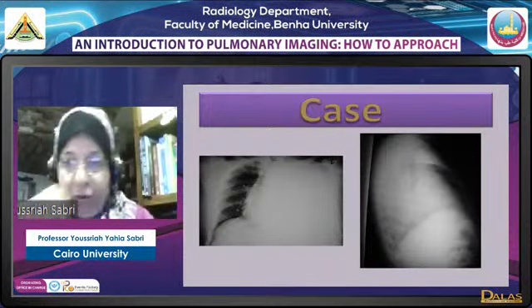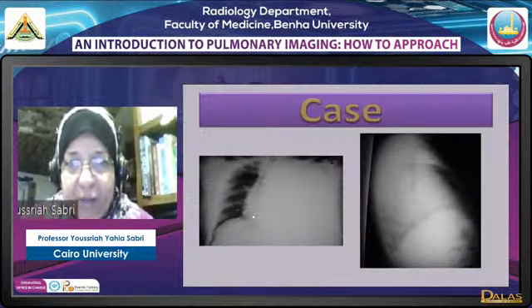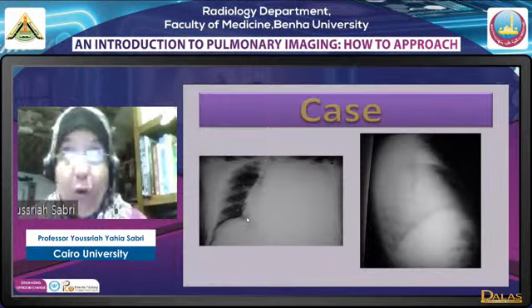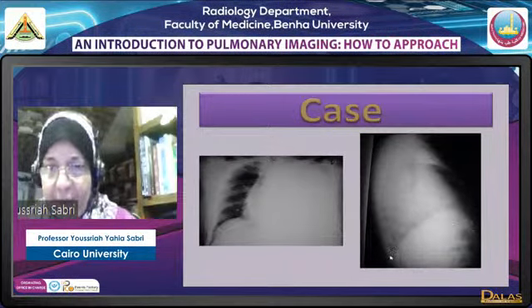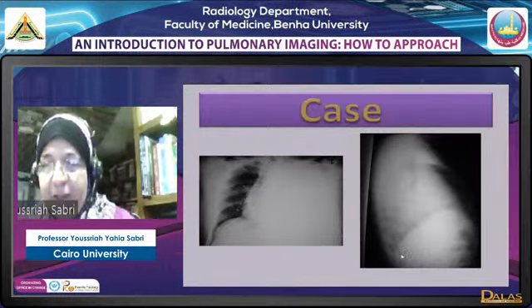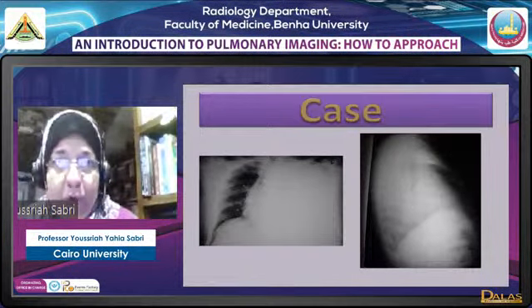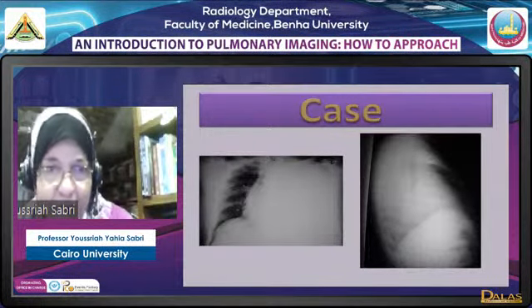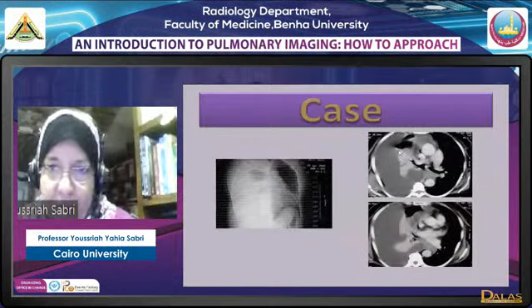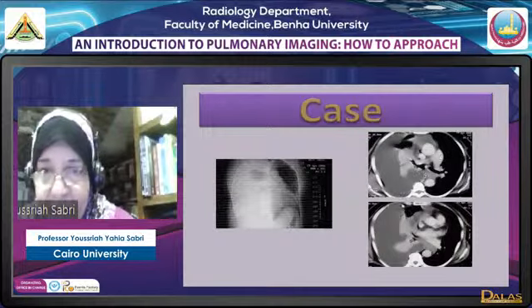a very limited differential diagnosis. Now, to start with, we have total opacification of left hemithorax with contralateral mediastinal shift, a typical appearance of what? Of a massive effusion. A very interesting finding here, if you look here at this lateral film, we find that we can see the right cupula all through, and we don't see the left cupula at all, because actually this opacity is left-sided, so it has obscured the left cupula. So this number 1, opaque with increased volume, is effusion, massive effusion. Now, CT findings here, we have the massive effusion, we have the relaxation collapse of the lung, and we have contralateral shift.